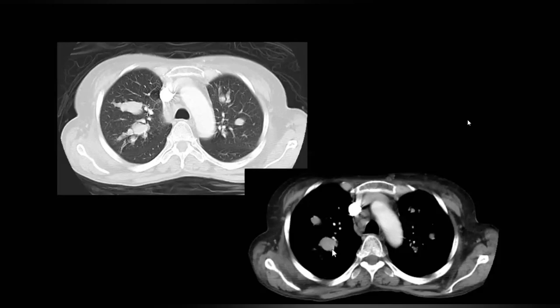Again, sorry, we don't have the pre-contrast, but what do you think of the density of the mucus plug? The density appears to be more than that of fluid. This is likely because it is filled with mucus. It has a proteinaceous component, so the density would be slightly higher than what we see in the fluid component. Do you have any other explanation why you see hyperdense mucus plugging in allergic bronchopulmonary aspergillosis?